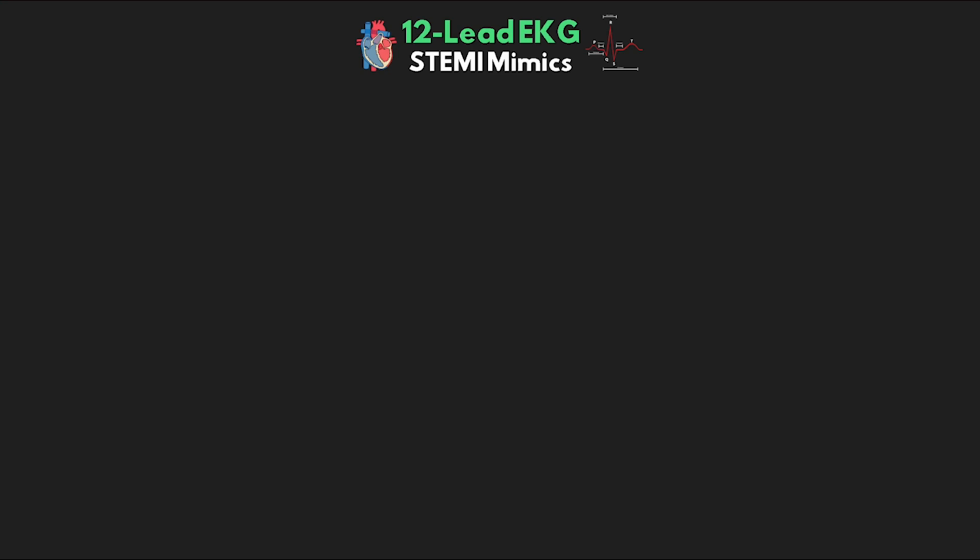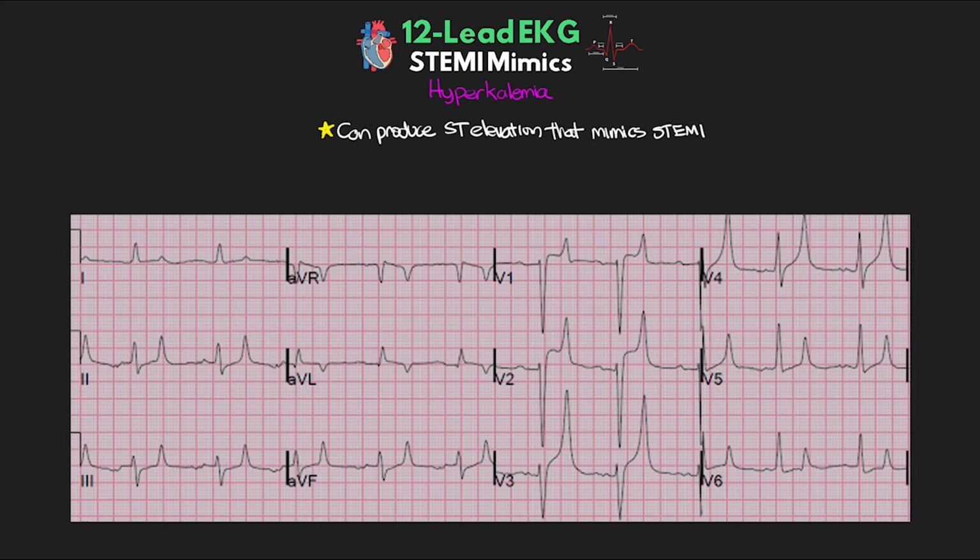Alright, so on to the next one. We just mentioned this, so let's go ahead and talk about hyperkalemia now. So hyperkalemia can produce ST elevation that can mimic STEMI. So in our example here, we can see clear ST elevation in leads V1, V2, and V3. So is this an anterior septal STEMI?